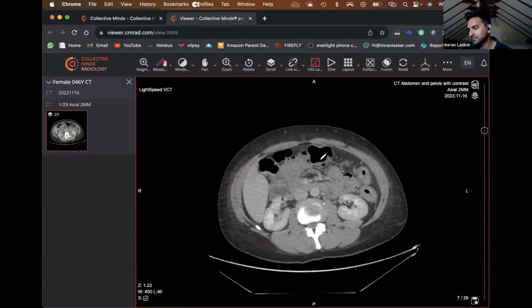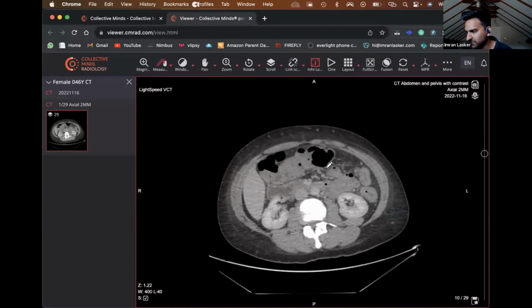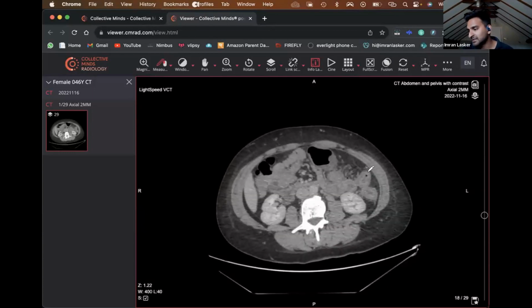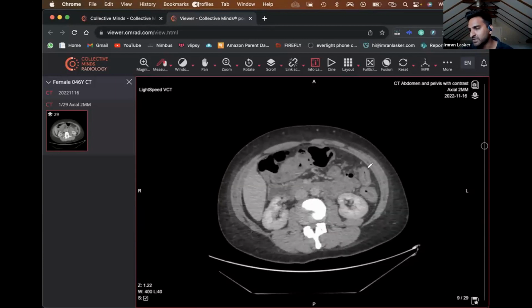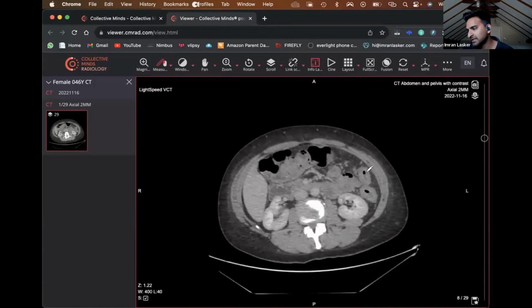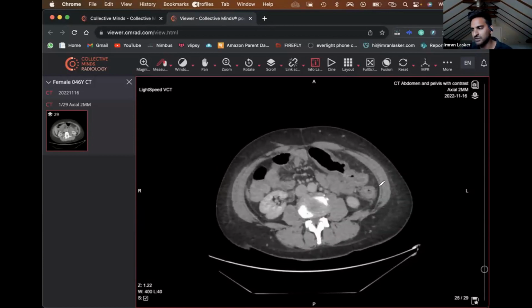But what we can see from this is that there is some inflammation of the bowel. So if you look at what looks like transverse colon, look at that bowel wall. Very, very thin. When you come up to the bowel wall over here, it looks very, very thick. Now when you look around, you can't see much in the way of fluid, maybe some fat stranding, not much in the way of lymph nodes on this scan, from what I remember. Unfortunately, I can't show you. But what you can see is that this looks like inflammation, right? And this looks like it's going probably to the splenic flexure and involving the descending colon.